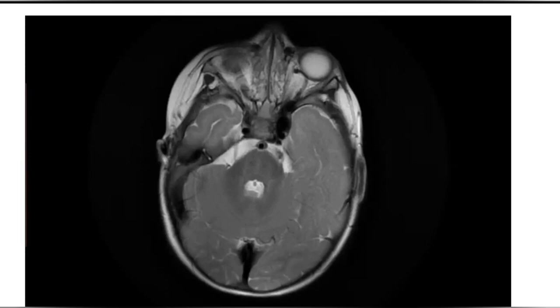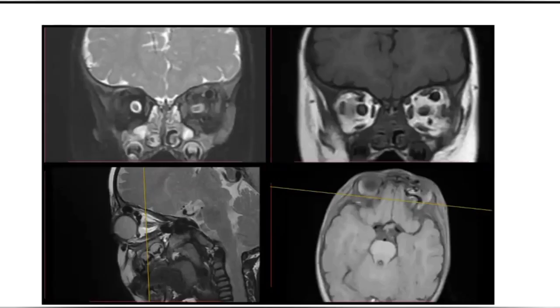So, on the basis of these findings, the findings are likely suggestive of carotid cavernous fistula. Yes, you're right. Do you want to confirm it on any other modality?